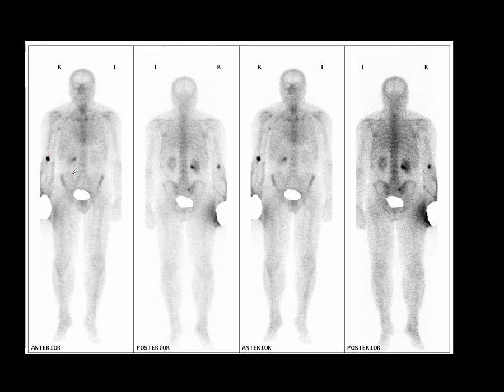So what's happening? Well, this is due to a tissued injection site. So the radioactive tracer has tissued out of the cannula, or more likely a butterfly needle, which was placed to inject it, and it wasn't noticed at the time. So the tracer has gone largely subcutaneous and been slowly absorbed. So the injection site was down here in the hand.